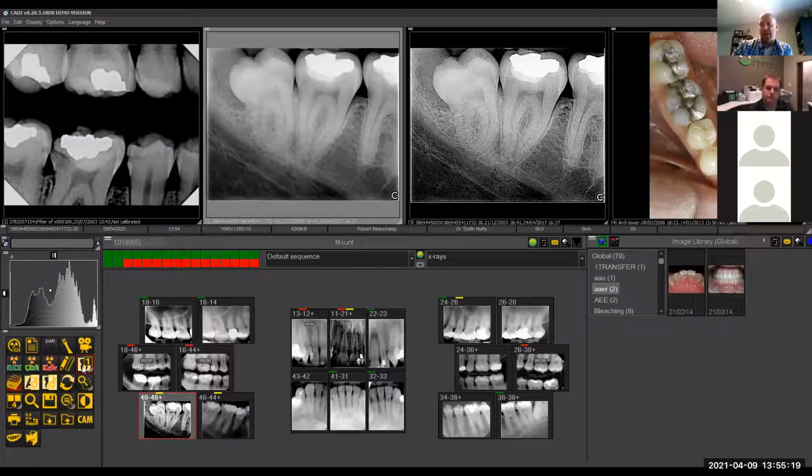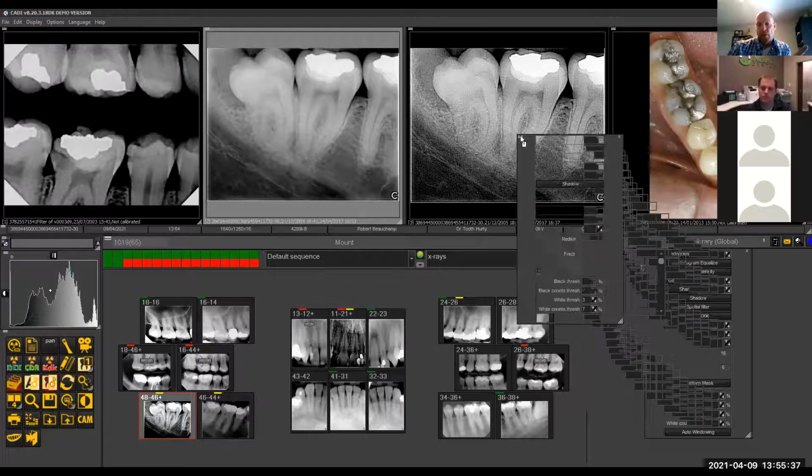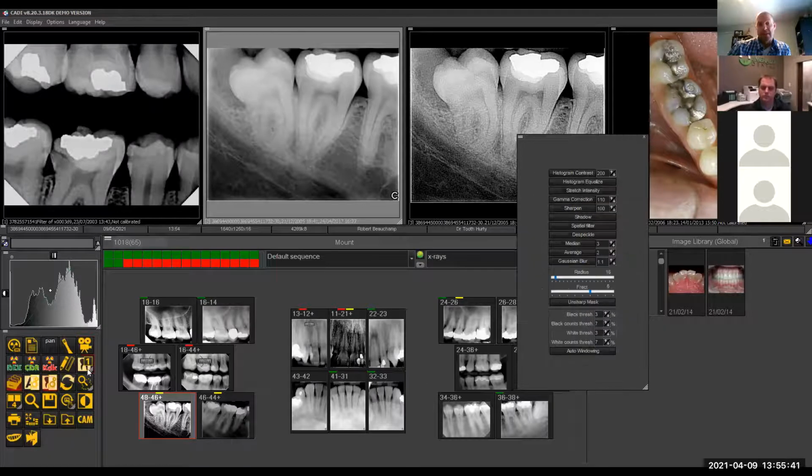But we can program it to be automated if you'd like. So we do that in the setup. That's something that the text can also help you with. Awesome. And then there's even a button here that I'll show you, which lists all the individual filters that we use when we're creating these different types of program filters.